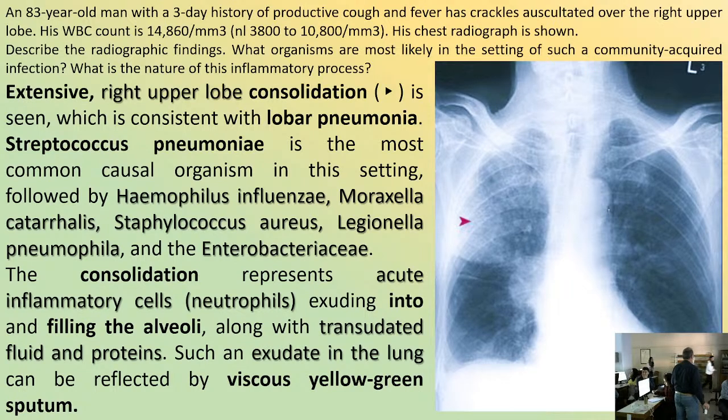And we had an X-ray with an area of consolidation. All right? It's evident on the right field of the lung. And we said that in this particular case, it's a sign of pneumonia with the classical definition of this disease, which means that the inflammatory exudate has filled all the alveolar spaces.